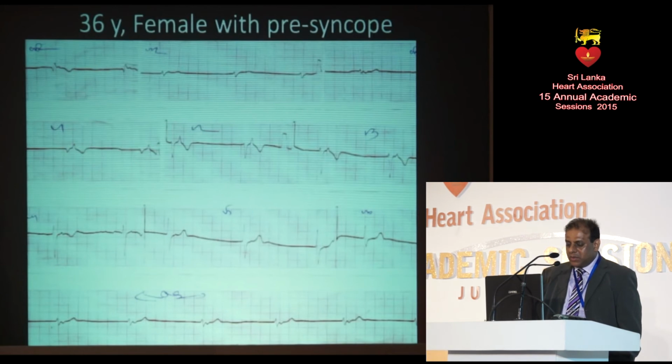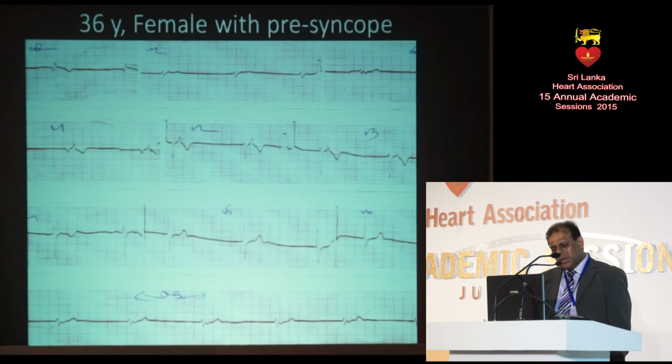So with an inverted P wave very close to the QRS, or a little far away in this instance, let's say that it's a junctional rhythm. Since there are more QRS waves than standard P waves, it goes along with sick sinus syndrome. It's not idioventricular rhythm.